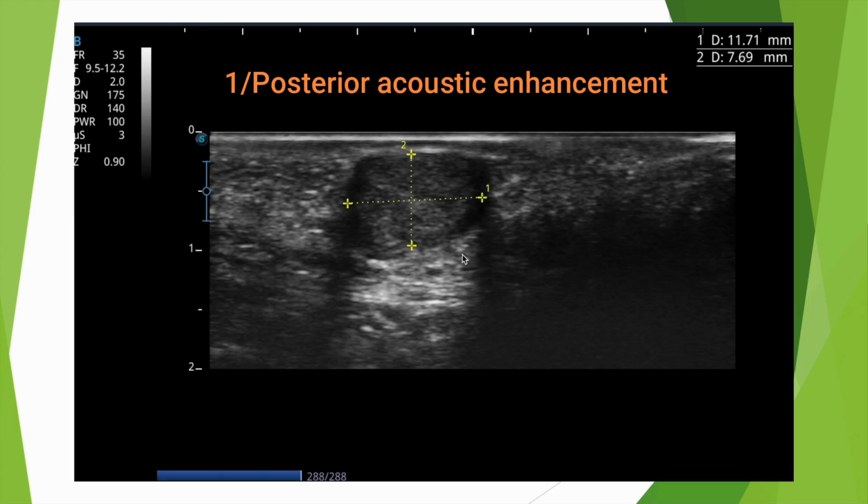I'll refer you to my introductory course, which is available to you for free. You can see here that the ultrasound waves are gradually attenuated, so the image gets darker and darker, so to speak. Whereas here, they're not attenuated by this part and suggest posterior enhancement. And that's the criterion that should make you think of something fluid-filled, and not at all just the anechoic or echogenic aspect. You can see here we have a mass that is echogenic but fluid filled. And I could show you cancerous tumor masses, maybe in another video, that are anechoic or almost anechoic.